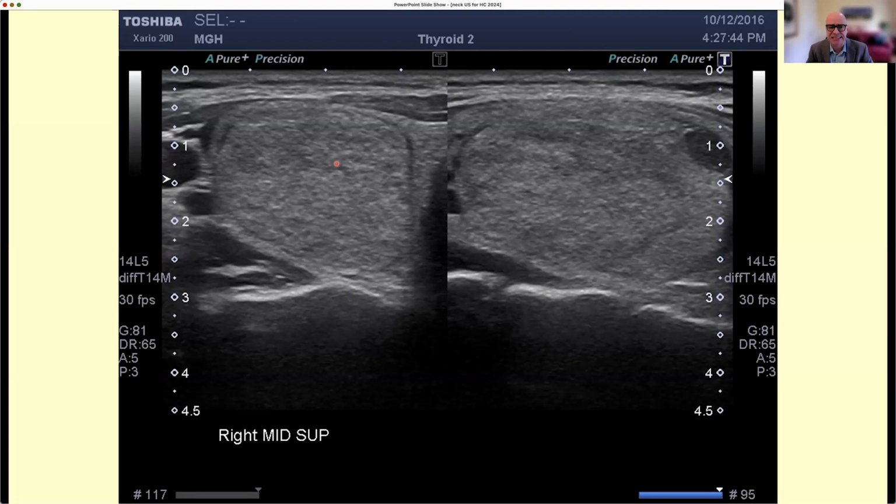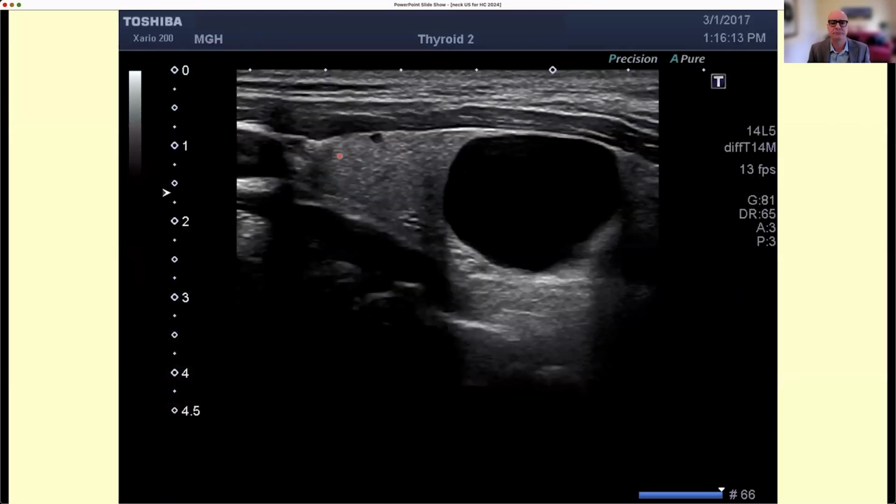So it's a nodule that has not lost the follicular structure of the thyroid, but it could have follicles that are very small. And so this is compatible with a structure that is benign very often, for example, in an adenoma that has follicles, or it could be consistent with a follicular neoplasm, a malignant follicular neoplasm, not very likely, but possible, because those follicular neoplasms do have microfollicles, and they do tend to generate echoes to a variable extent. So that's important in recognizing the structure of an isoechoic nodule.